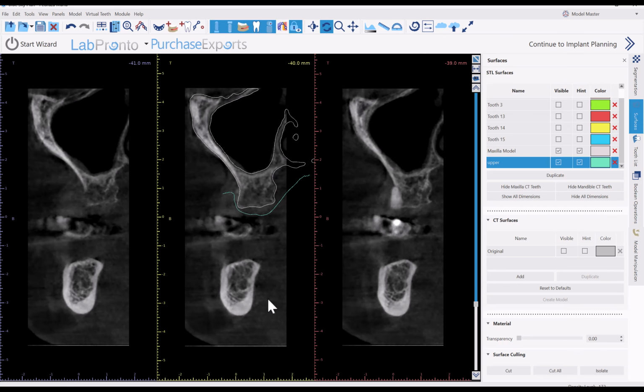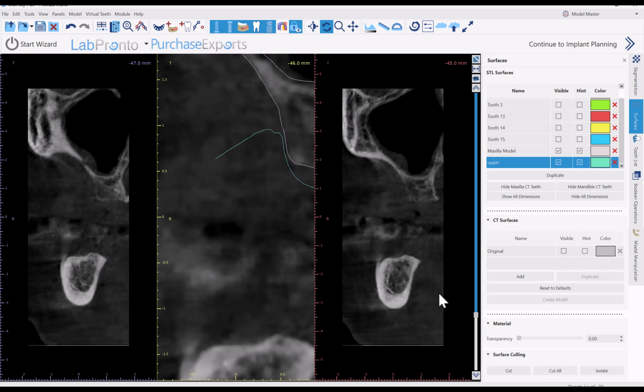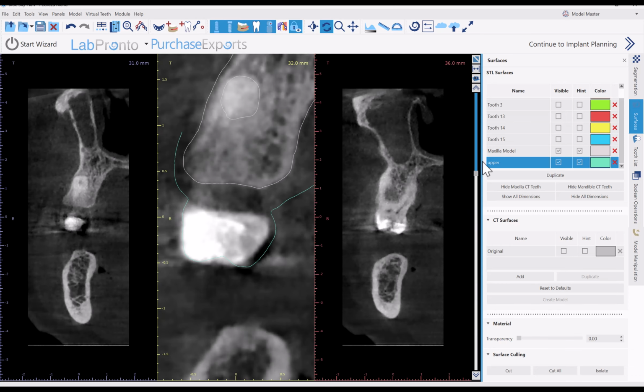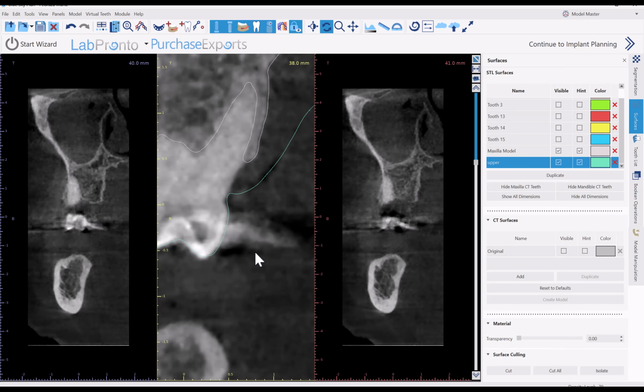And then the other thing I'm looking at is occasionally you'll see little air pockets right here. That dark black is obviously air, and then the lighter color is going to be the tissue outline, and that looks pretty darn close. We could look at it maybe back here as well. I think I saw an air pocket.